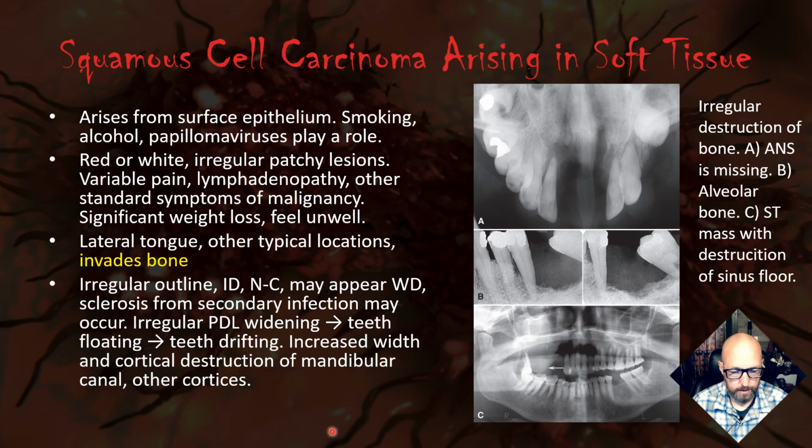This shows one, which I'd like to blow up if I can. Okay, what is the big worrisome thing in the panoramic radiograph here? Look for the anatomical structures.